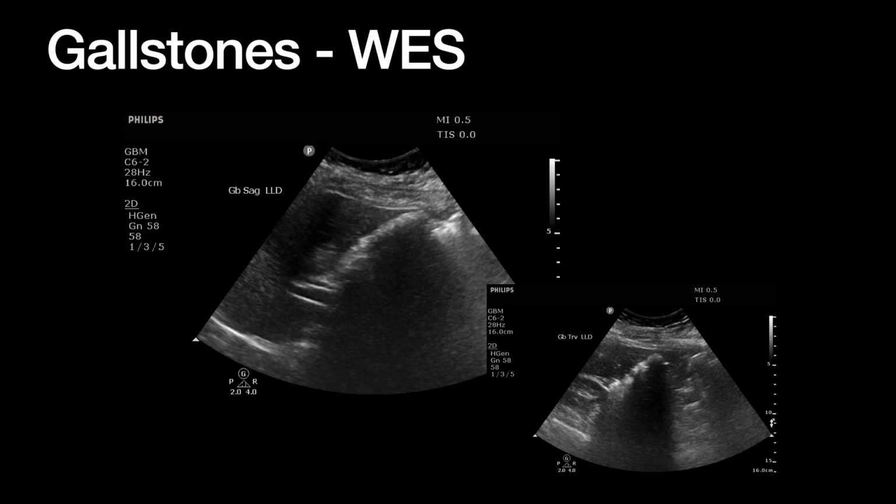And these I found are particularly challenging when you're scanning. Conceptually, it's like, oh yeah, it totally makes sense. The gallbladder is so full of stones that I won't be able to see anything. And the pictures I have here, like, okay, I see that. But when you're scanning by, it can be frustrating because you cannot, for the life of you, find this gallbladder. And that's because all you see is the stones and the shadow, and your mind is trying to find that blind-ended pouch, that anechoic lumen that we talked about all last week or last time.